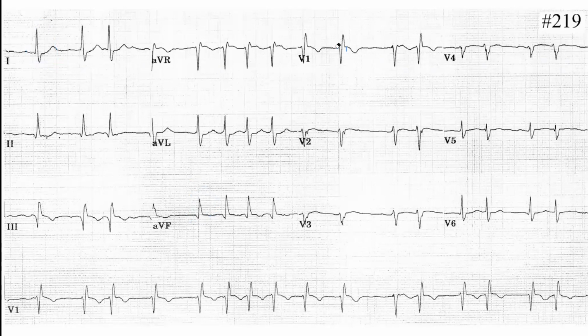Okay, good. Pathological Q wave. Yes, we see it in lead 3. Okay, only in lead 3. Yes. And negative T wave in lead 3.